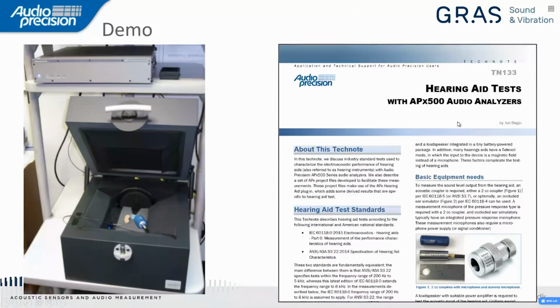Today I'm using the TBS 25 test box that I have here on the bench. I will be using an older analog hearing aid, and the reason I'm doing that is that I don't have to program it. It just has one program that it came with, and I don't have to worry about connecting a programmer and being able to download firmware into a digital hearing aid. So that's the device that I'll be testing today.